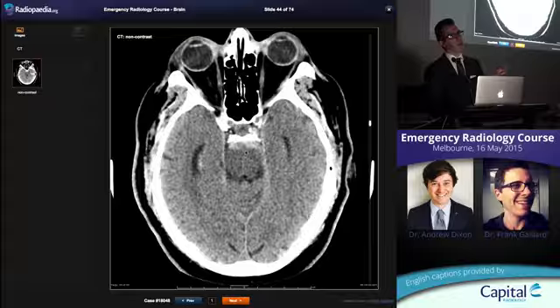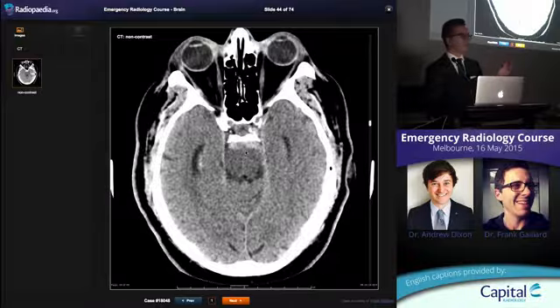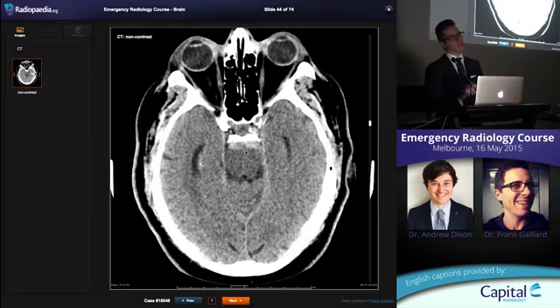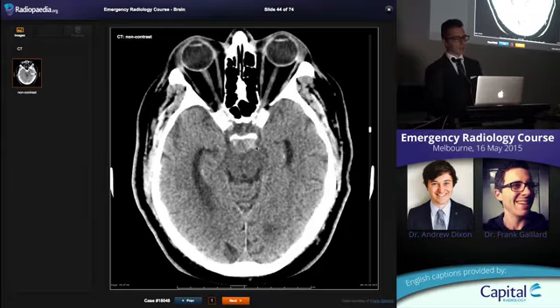Because one of the things that can happen is very small vascular malformations, including aneurysms, can transiently be compressed or invisible due to clot. And so before you give someone a clean bill of health, you need to know there's nothing that needs to be treated. Because if they rebleed from any of those lesions, the next bleed you're usually not as lucky. But this is a very typical pattern, and it's usually centred here in the interpeduncular fossa, just behind the clivus, between the two cerebral peduncles.